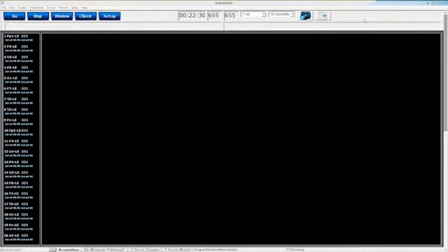Are the Inhibit Sounds in BrainAvatar a library, or can you also use MIDI sounds? Well, yeah, you can. The Inhibit Sound basically says, I don't want any sounds. The reason that I use that is that if it was greater than the upper threshold, when it went below the lower threshold, the MIDI sound can still occur. So we want to inhibit that from occurring. So it's saying that it's still bad, or I'm now giving it reward sounds. It's just saying stop playing that sound. You could probably use the MIDI sound as an inhibit sound. If you don't want something to occur, you can probably use it as a negative reinforcement type thing, yeah.